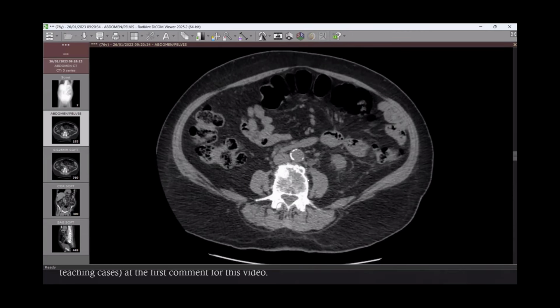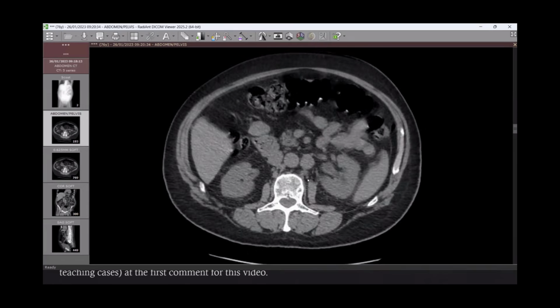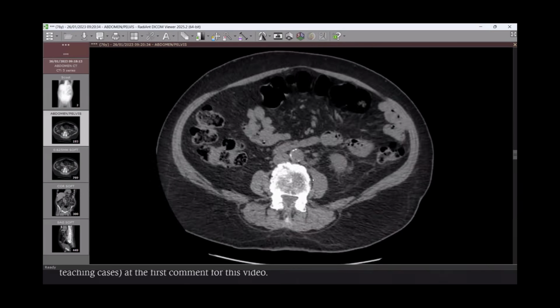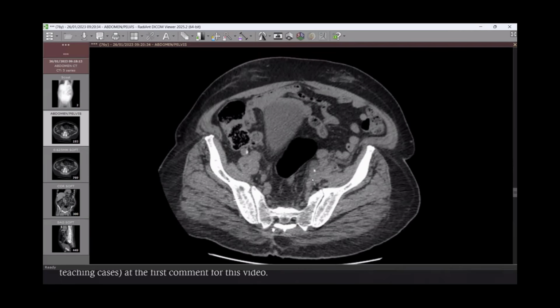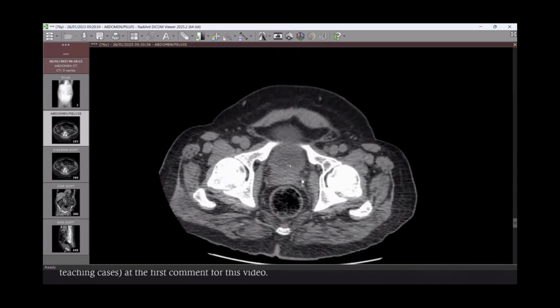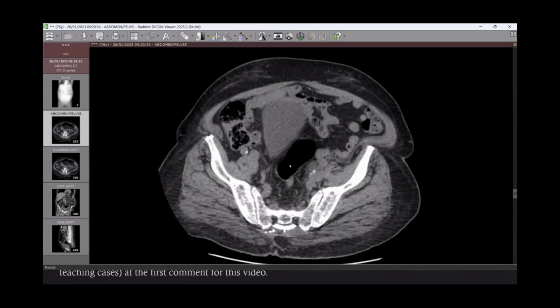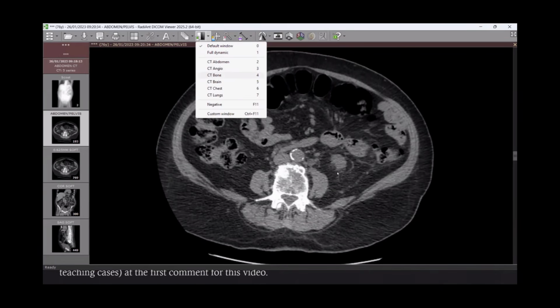How can we narrow our differential diagnosis in this case? We would like to correlate with metastatic lymphadenopathy. The nodes appear pathological. They are enlarged and rounded. How can we narrow our differential diagnosis? We would like to correlate with the history of the patient and also with inflammatory blood markers, and any previous images if available.